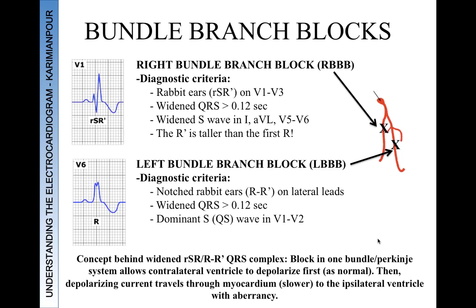So in terms of blocks, let's start out talking about the bundle branch blocks. We have two different types, just to sort of break it down into broad categories. We have right bundle branch blocks and left bundle branch blocks.